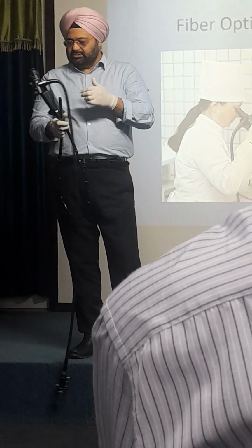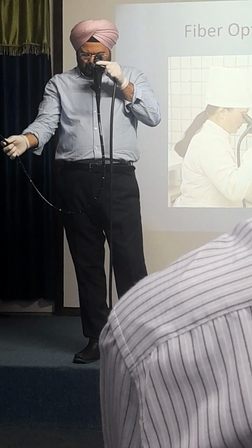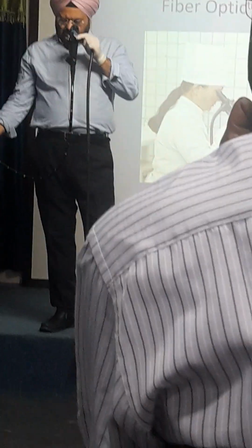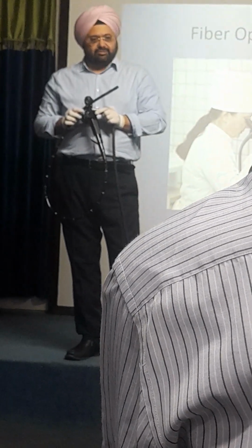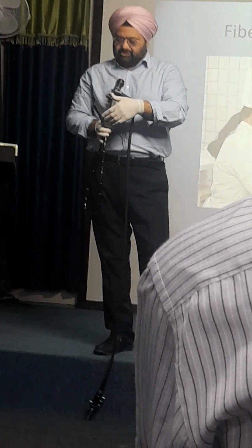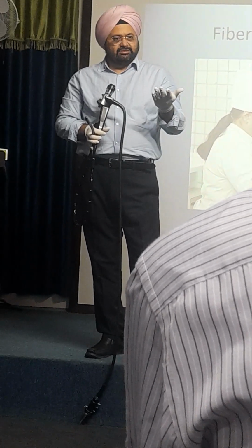So how are you going to use it? Because this is the only thing, this is the eyepiece which will show you. So you use it like this. And this is not a very enlarged image, isn't it? This is a very small lens system, and a little bit of magnification, and you introduce it and you work like this, seeing through this eyepiece at all times. That's the only thing. No image, and because there is no image which is formed anywhere except your retina, you cannot even capture an image. There is no image to capture, isn't it?